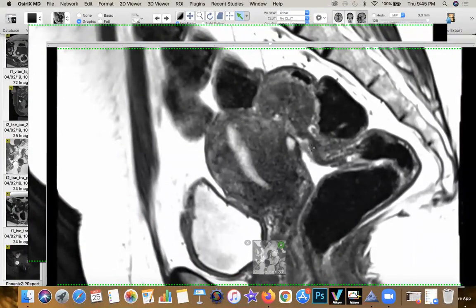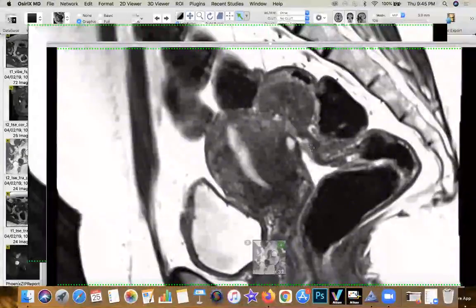So here, what I've shown you is that in clinical practice, when you have a patient with perrectal bleed, it's very important to get the organ of origin. Very often in males, we have seen carcinoma prostate invading the rectum, and CTs being reported as a rectal cancer going into the prostate. Usually, it's very unusual for that to happen. It's more likely for the prostate to go into the rectum.